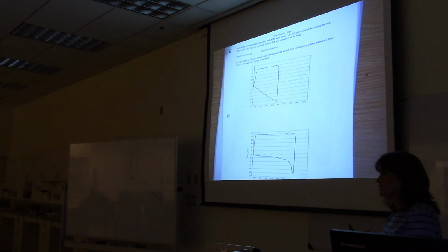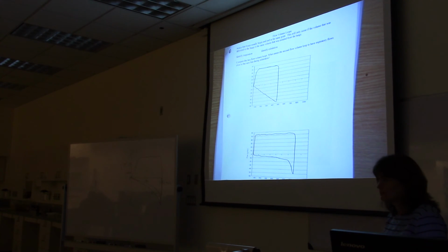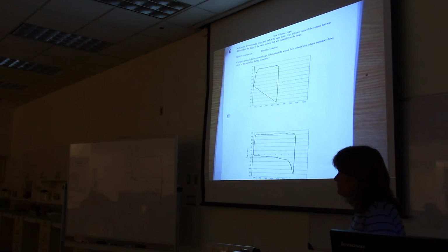With airway obstruction, the patient tries to exhale and the airways close and the air can't get back out. So obstructed airways will cause a flow volume loop to look like this. Oh, so then the tidal volume that was initially put in is still there. Is it all out? It all came out because it comes back to zero. It just took a while. Yeah. All right, so the second one, you have obstructed airways, preventing the flow from leaving the lungs.